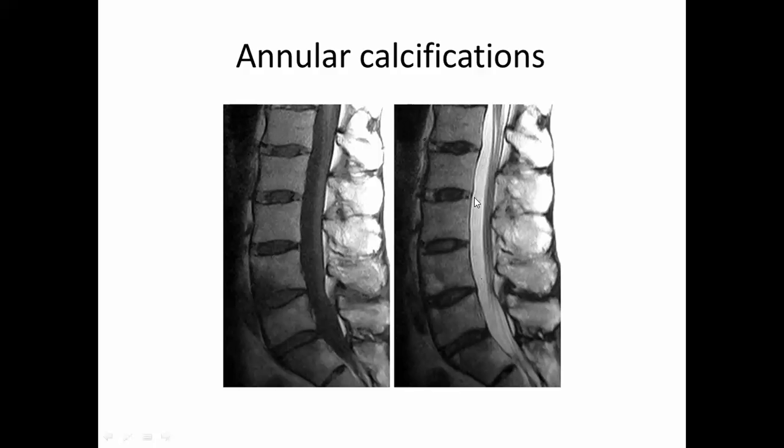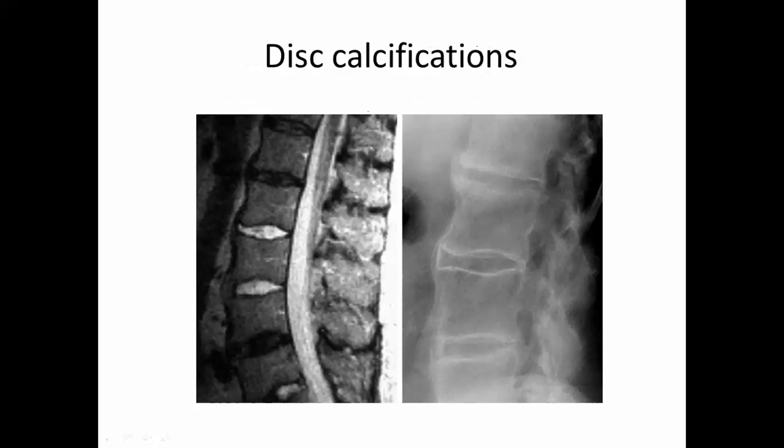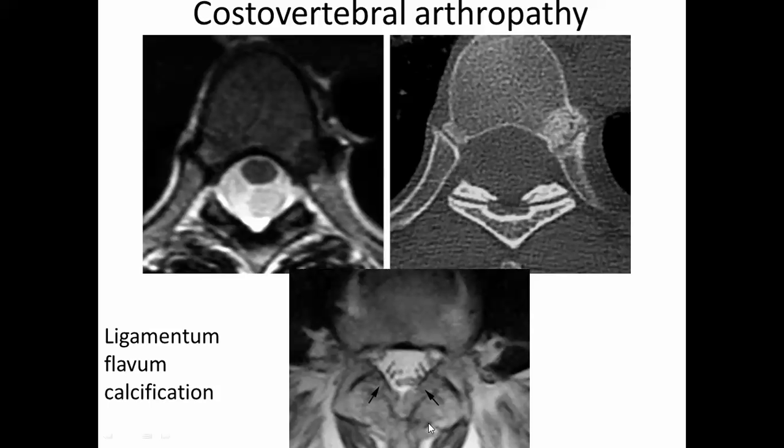So another cause for calcification of the annulus, we have ochronosis, and the second is ankylosing spondylitis. So here we get the disc calcification, like that. And if you imagine faintly, there is something inside here and there. Disc calcification, as well as calcification of the anterior spinal ligament.